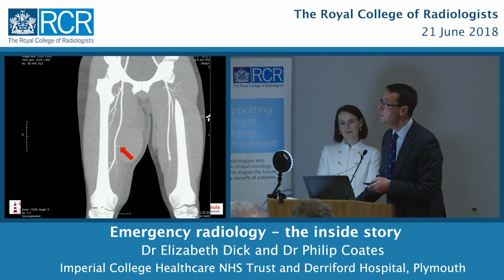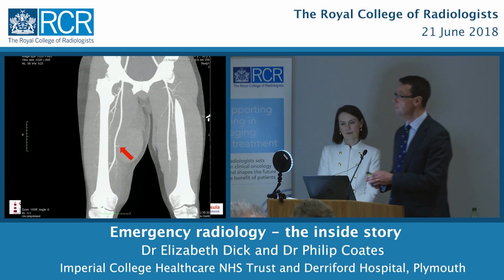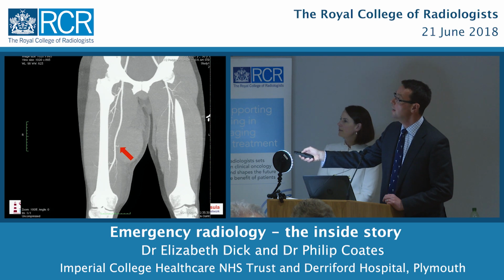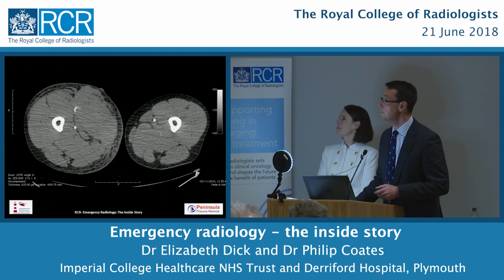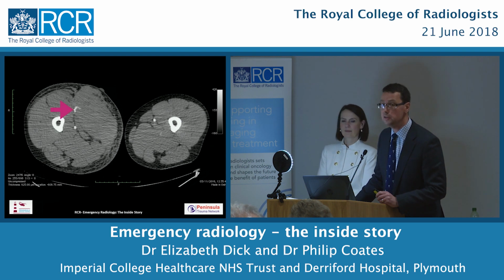Okay, so if we coronally reformat that, so we're looking down the body in this direction, there's a couple of things you can see here. First of all, there's hematoma bulging the fat in the adjacent muscles, and this little blob here is evidence of bleeding from a side branch of the femoral artery. To show that a little bit more finesse on that specific slice on the axial section, there it is, and that's going to be the target for any treatment.